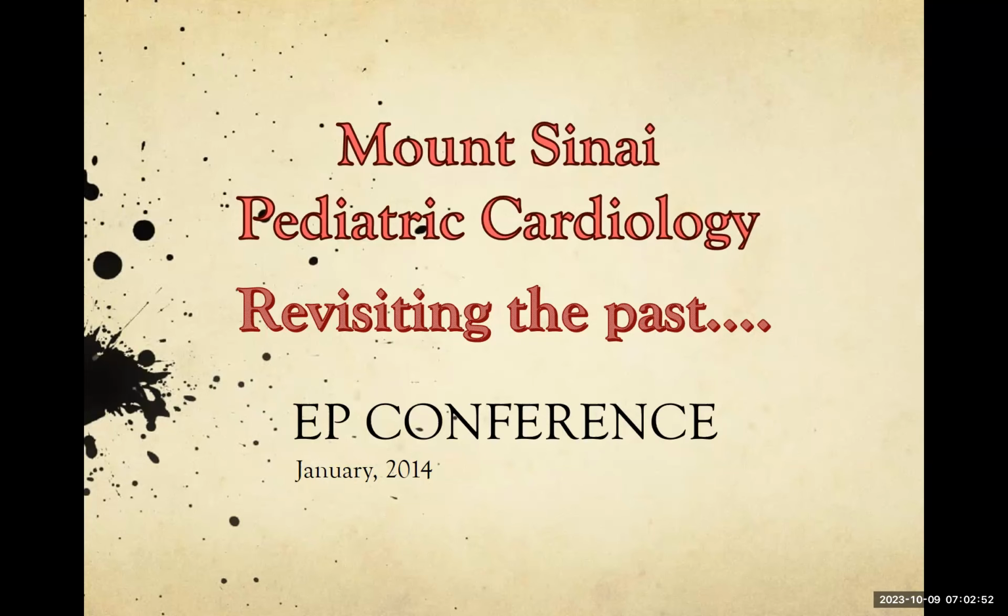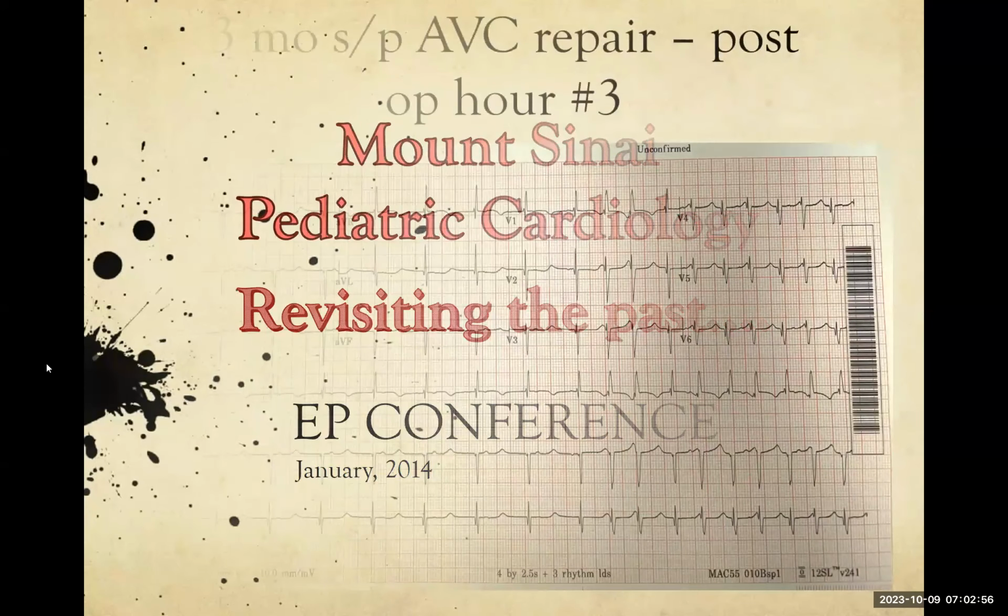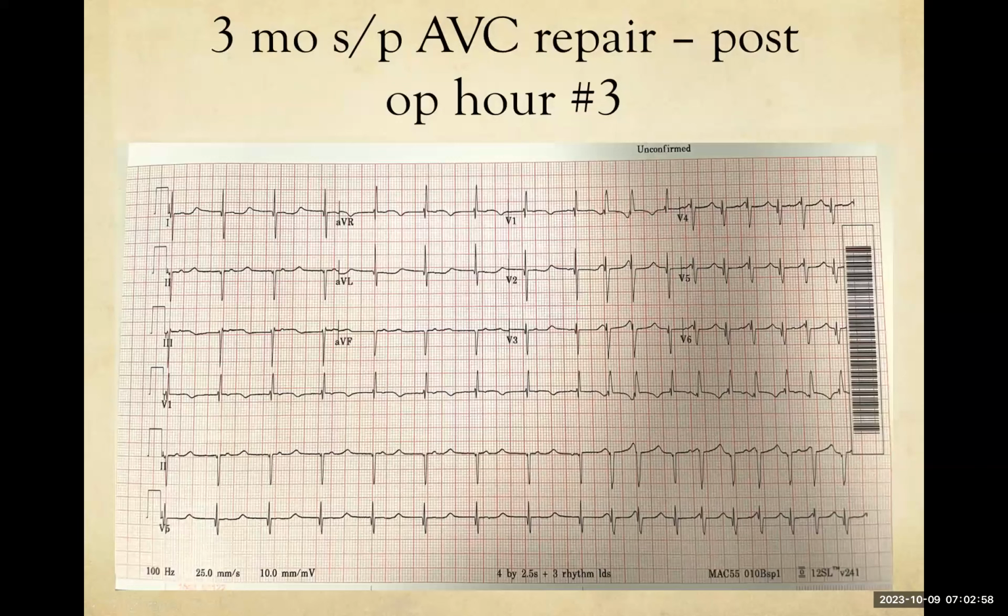All right, why don't we move forward? Okay, so this is a 3-month-old who had an AV canal repair, and this is post-op hour 3. And this is the patient's spontaneous rhythm. So why don't we see, Molly, what do you think's going on here in this patient?